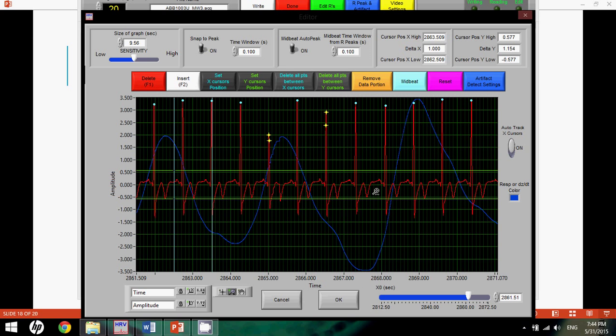This doesn't require you to look closely at all of the data because it doesn't happen systematically enough that you'll need to do that. However, in this case, it's clear that it is the case. You have drop packets here. You can largely tell from the respiration. This often manifests as a dropped square line, and we'll see that in a future example as well.